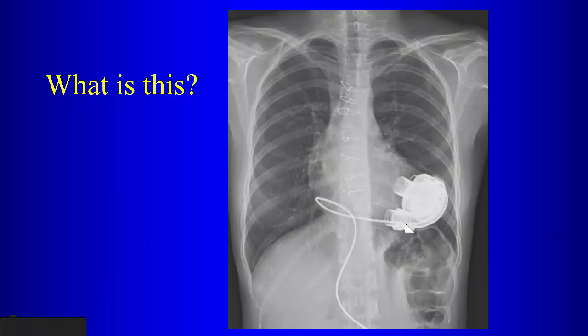This is an LVAD. This is a left ventricular assist device. Okay? We don't see these as often now as we used to see them. Why?